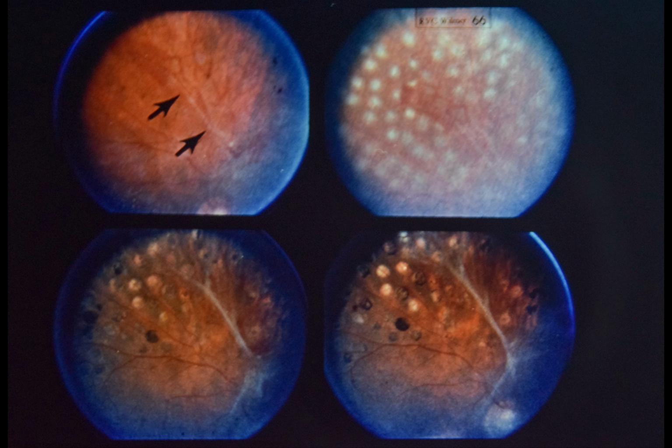Comment: this patient has maintained 20/20 vision for the past year. He has had 1 minor vitreous hemorrhage from a frond of disc neovascularization, which is not amenable to focal argon laser photocoagulation because of accompanying fibrous tissue. The frequency of the vitreous hemorrhages has been significantly reduced since photocoagulation.